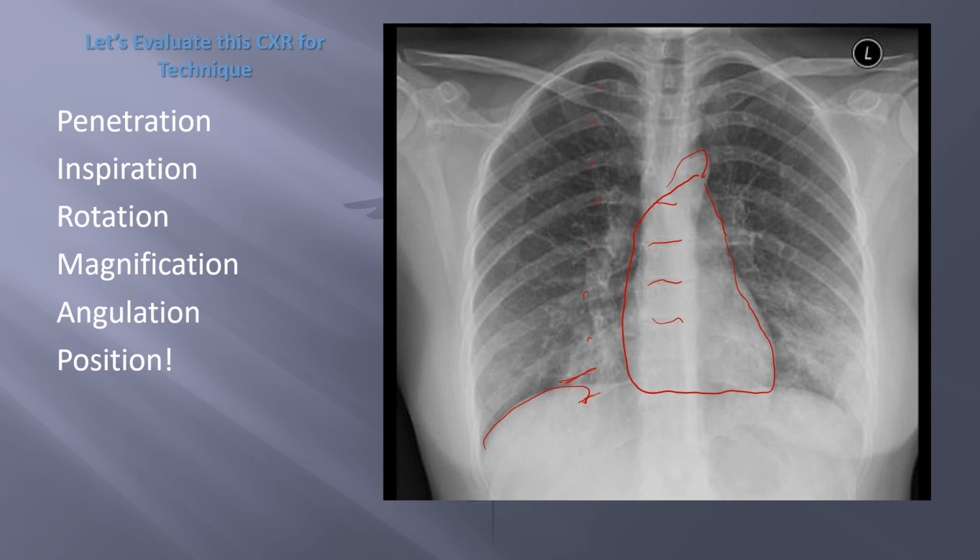If the diaphragm were here, this lung tissue might be all bunched up and appear more dense. So you have adequate aeration here, adequate inspiration. So this is what you want to look at, the lung tissue in this phase. Magnification: this is an AP film. So we're going to note this is an AP film, which might project the heart silhouette a little bit larger than normal, but this is still within normal size.